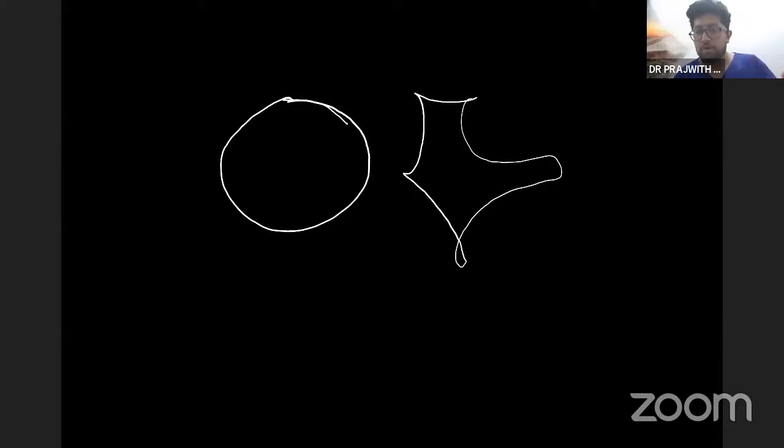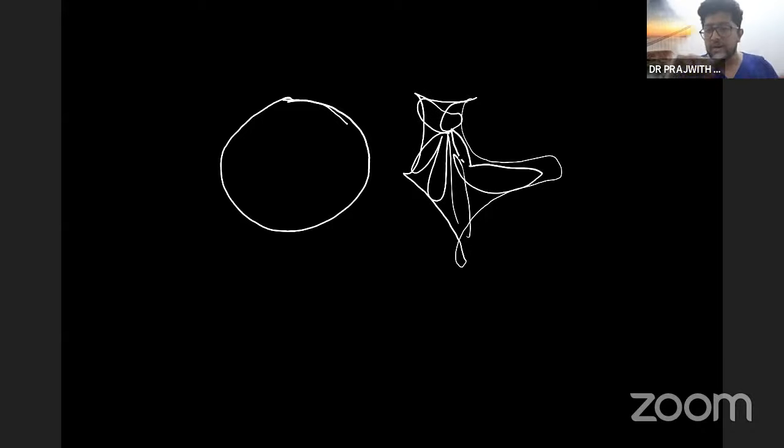It can be multiple glandular tissues which are compressed and might look like a dense lesion, but it may not be a mass. So it should have a convex outer border, and it should be seen in 2 dimensions.